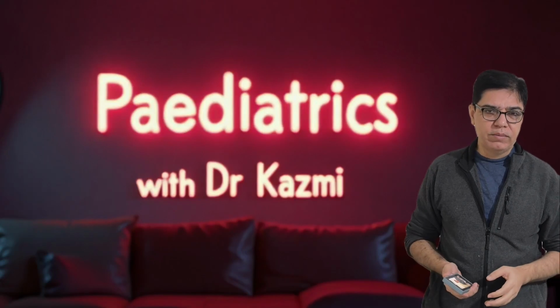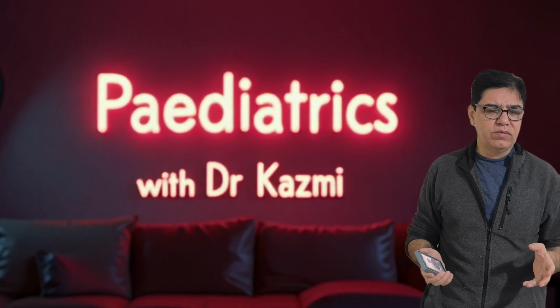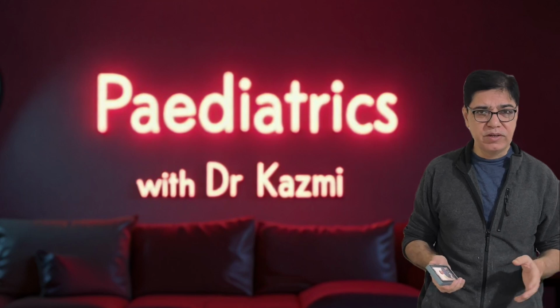So today I will be talking about how do you diagnose emphysema on a chest X-ray. Now, if we talk about pleural effusions or pneumonic consolidation, it's very easy to pick it up on a chest X-ray, but emphysema is a bit difficult.